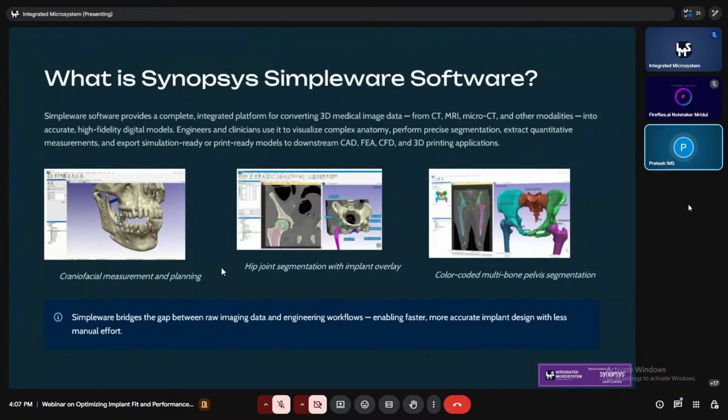So basically, this is showing the acetabular cup implant in our hip region, and this is the right hip. We will see this example in today's session, and we can directly export this scene to the disk view and directly go for 3D printing, and we can go for surgeries also.